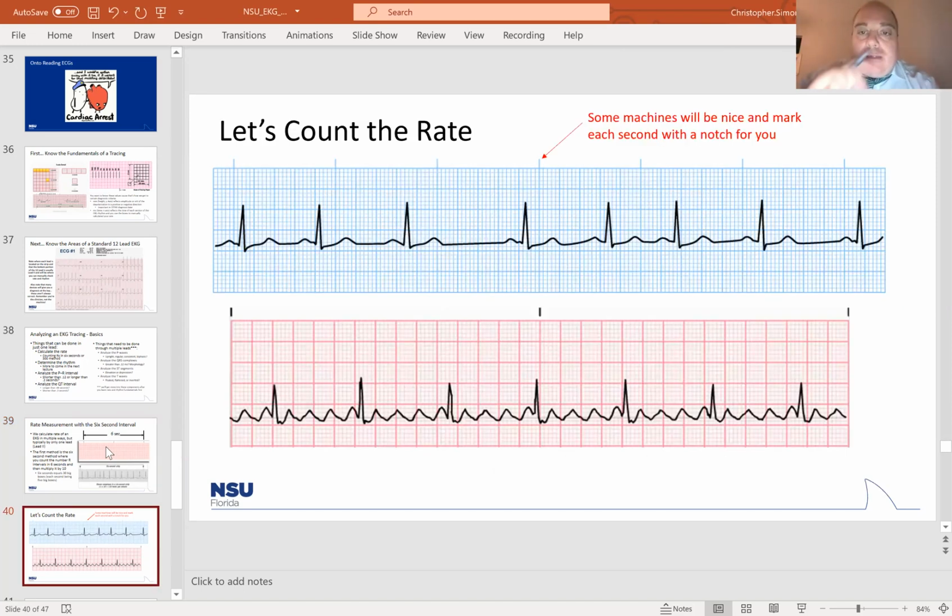Okay, so let's count these rates. All right, so let me move this out of the way so I can see what I'm doing. So we got a couple of rhythms here, guys. I don't expect you to know what these rhythms are. Don't worry about any of that right now. We haven't really got there.